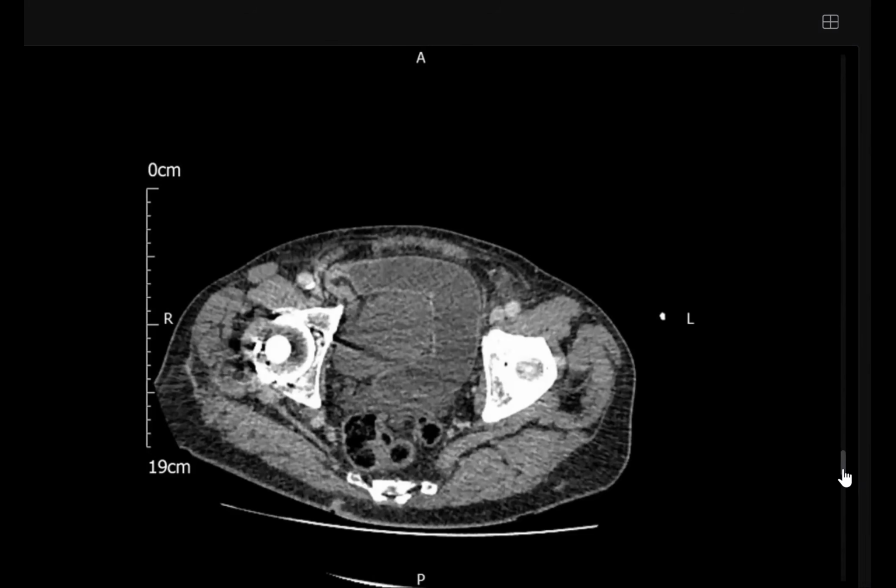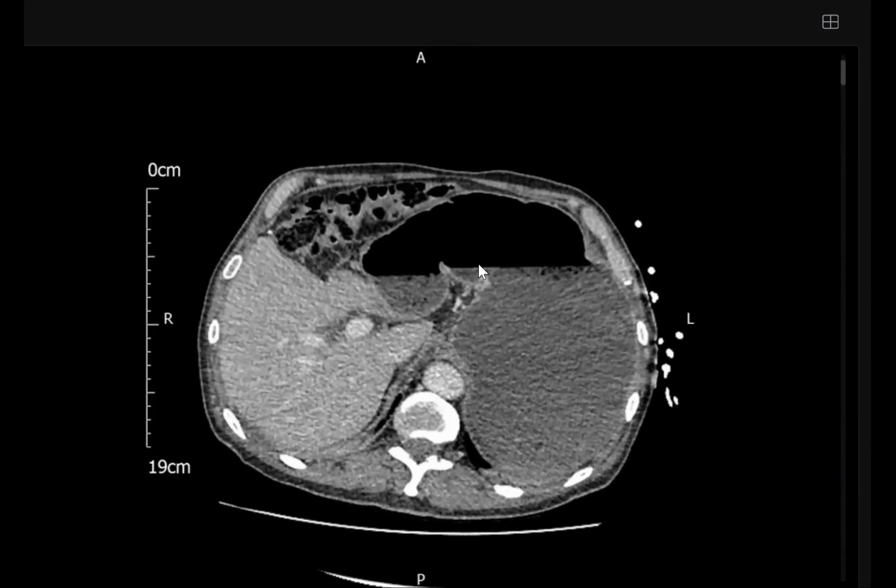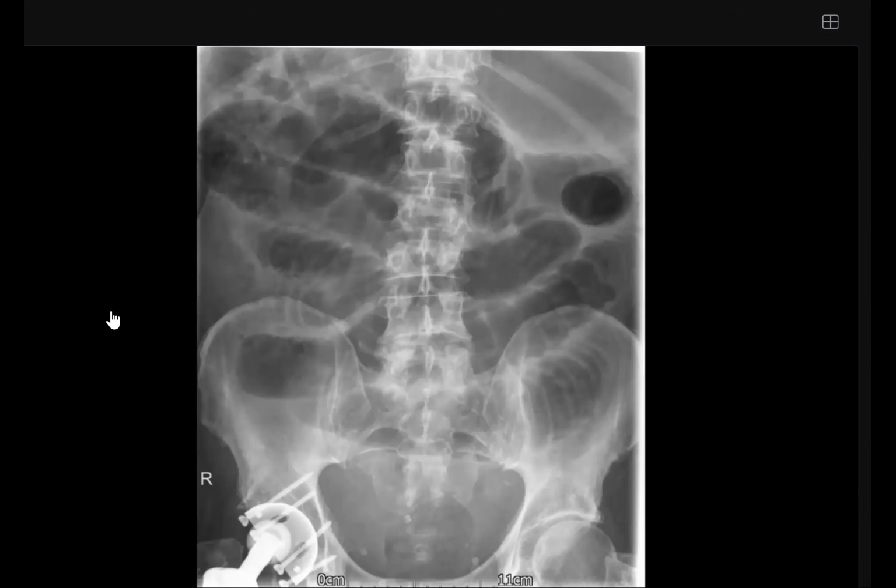So from the start, I will finalize it later. From the start, you have a very good start. Regarding the radiograph, it's a small bowel dilatation. I need upper abdomen and I need lower pelvis. Upper abdomen in erect to rule out free air and to assess and confirm this possibility.